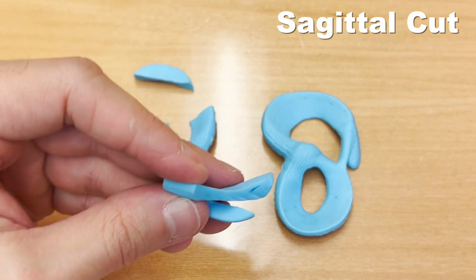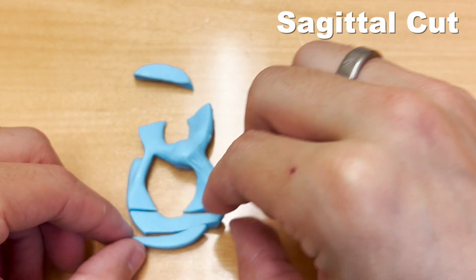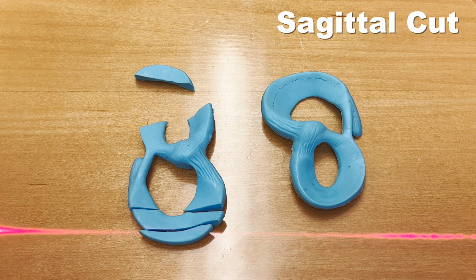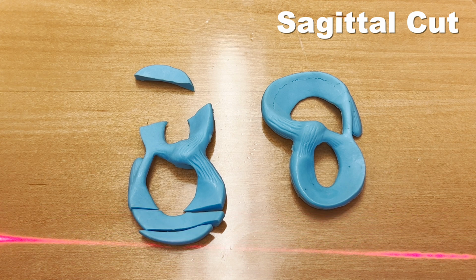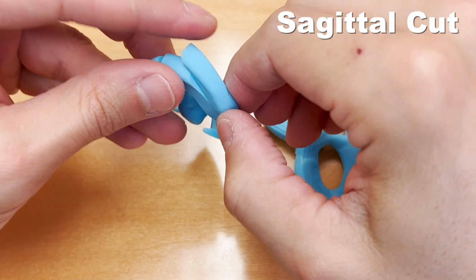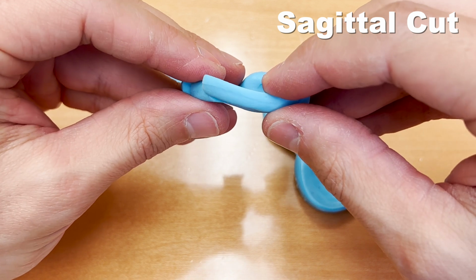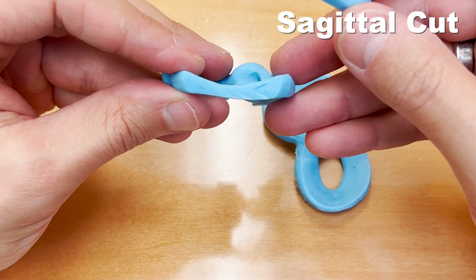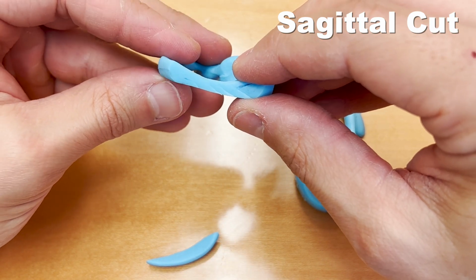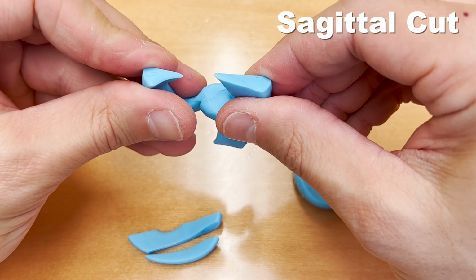All right, so now we'll put that back together. Now here's our laser line. We're moving through the meniscus like this. So we've got a cut here and a cut there. As we move through on our actual MRI cut on the meniscus, we go through our cut number one, and the meniscus will look like that. Then we'll go through the second cut after that, and you can see how the meniscus cross-section changes.